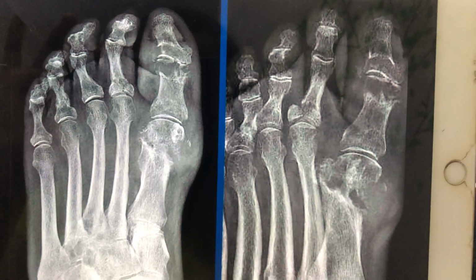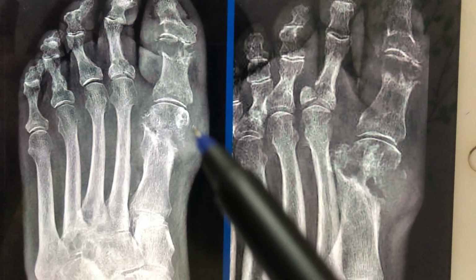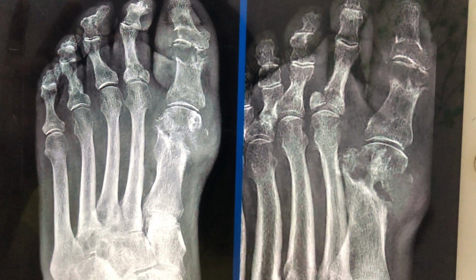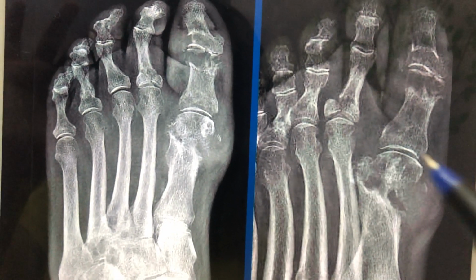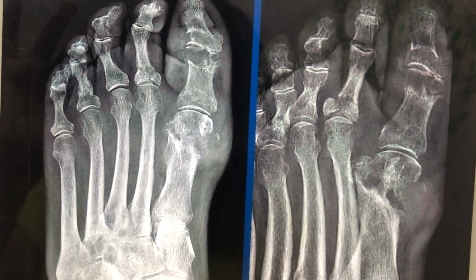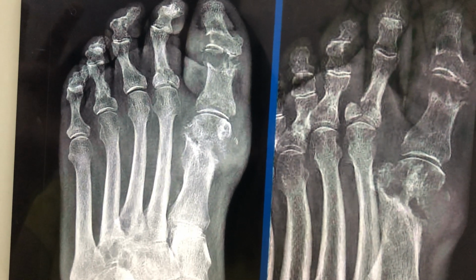In rheumatoid arthritis, there is no bony proliferation in the active phase, whereas in gout, you have significant bony proliferation giving rise to these rat bite or mouse ear appearance, whatever you want to call them. There is preservation of the joint space predominantly. Apart from that, there might be chondrocalcinosis, deposition of calcium within the cartilage.